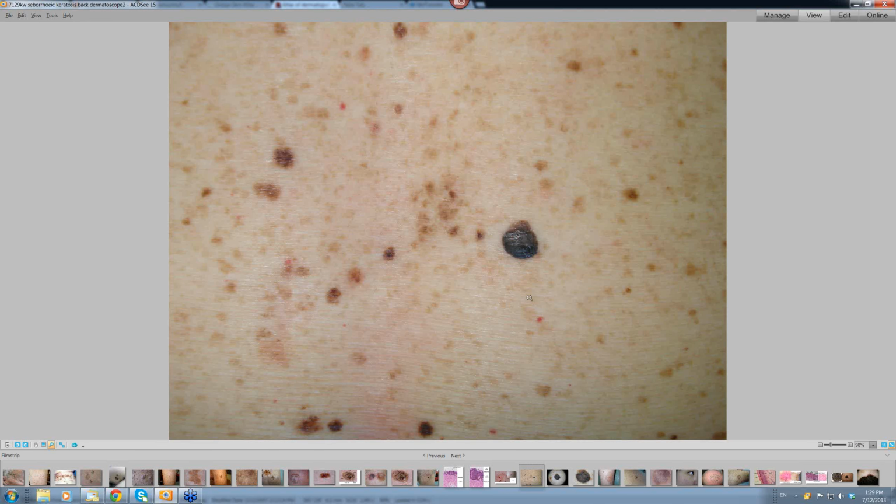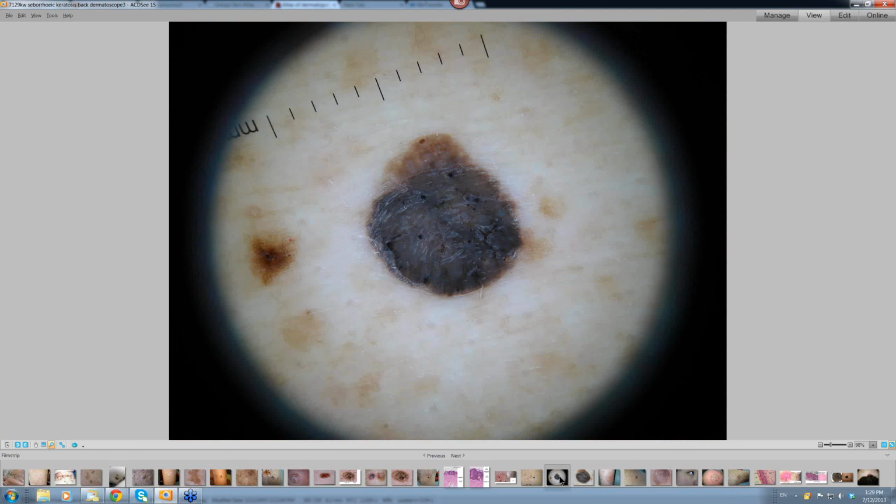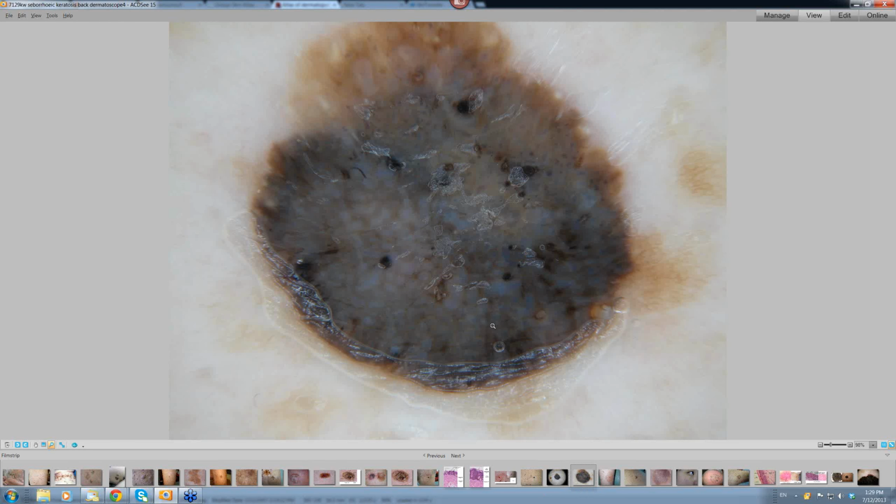Sometimes SEBKs can be very dark, as in this particular one here. And if you look at this, there's the dermatoscopy, exceptionally dark. When you look a little bit closer, you even get bluey shades in here, because this is a very thick lesion, and so there's also a lot of melanin in the keratinocytes here. This is a keratinocytic lesion, and it's blue like this because of the thickness of the epidermis here. Normally you associate the blue color with melanin pigment in the dermis, but if you've got a really thick epidermis like this, then you'll get a bluey shade to seborrhoeic keratosis as well.